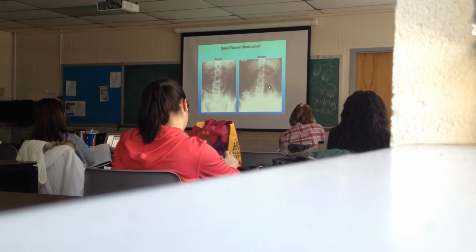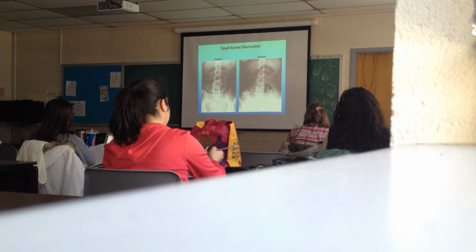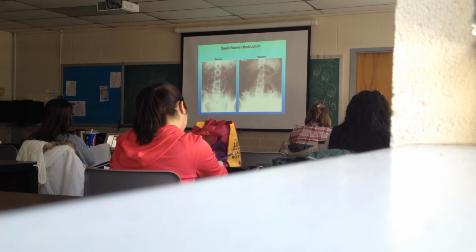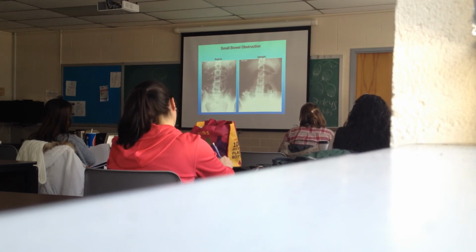The only reason you can see this loop of bowel is because it's filled with air, and air acts like a contrast agent. The rest of the bowel is filled with stuff, probably fluid, and it's just blending in with the rest of the soft tissues there. Fecal material doesn't have any air in it, it could be collapsed. This has lots of air in it, so air itself is acting like a contrast.